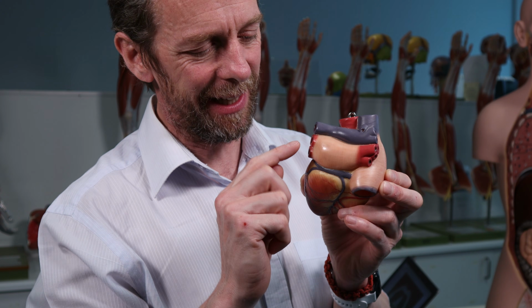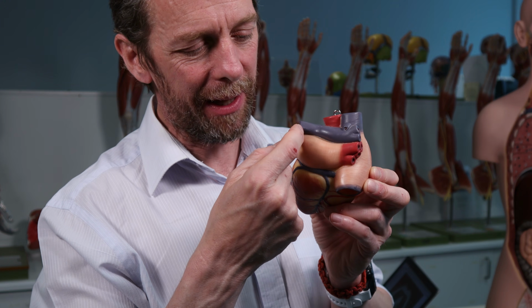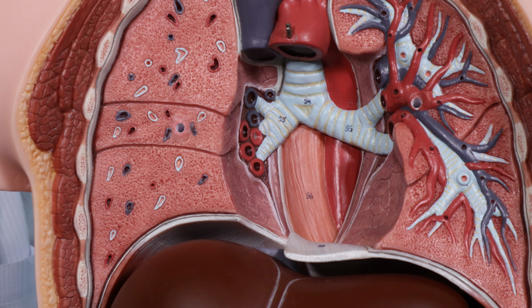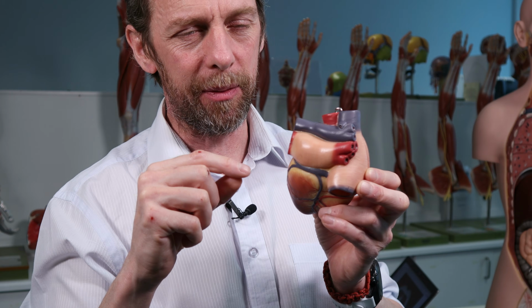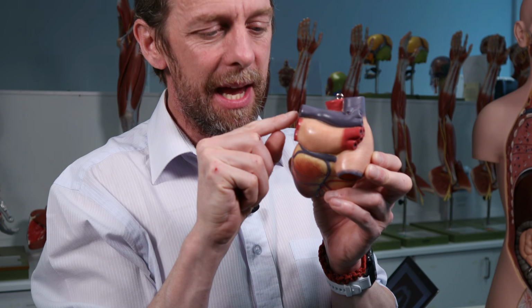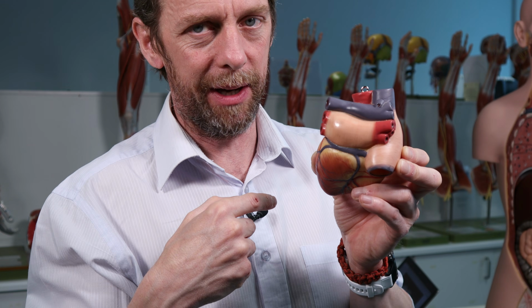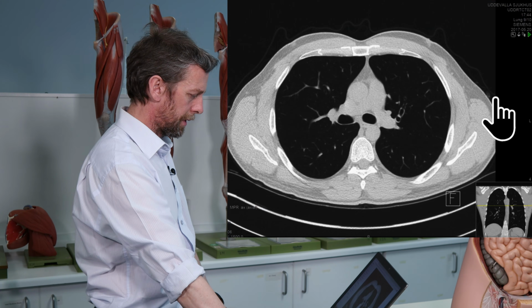And whenever we're dissecting, what we see depends very much on how far away we cut from the heart. So if we only go a little way away from the heart, or a little bit further, there are lots of pulmonary venous vessels all coming together still. And if we cut really close to the heart, then we start to see a pair of pulmonary veins on either side. So that's what we're looking for, and it might be a bit indistinct.